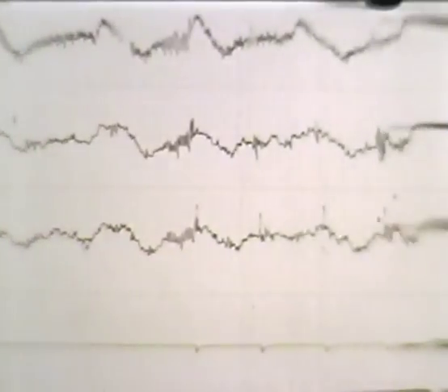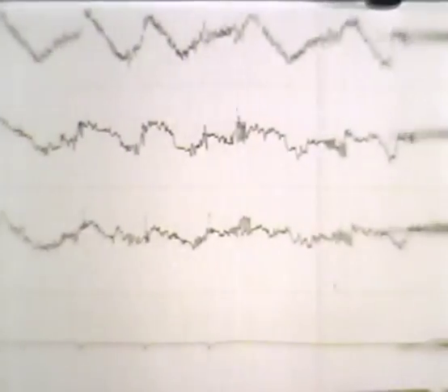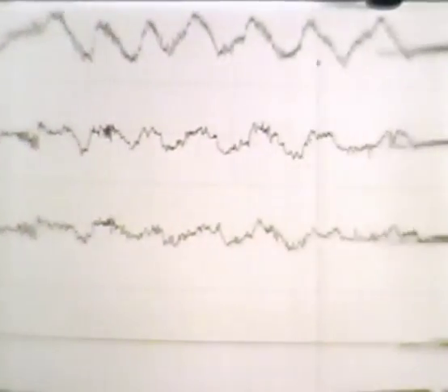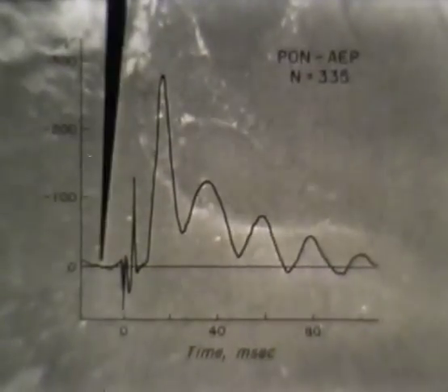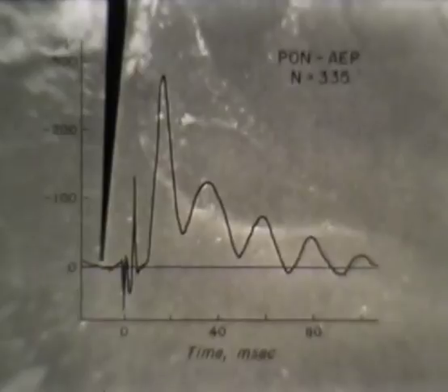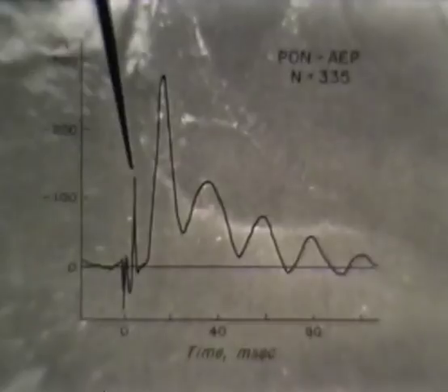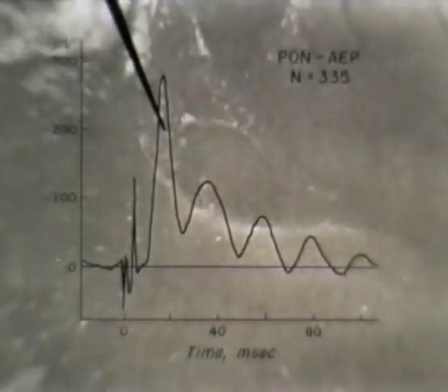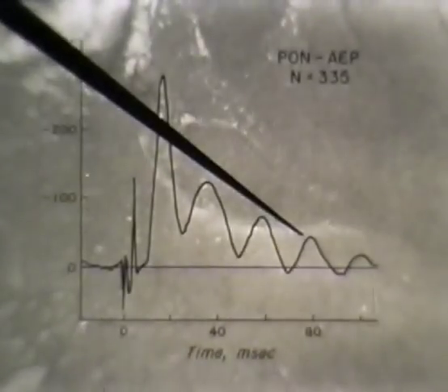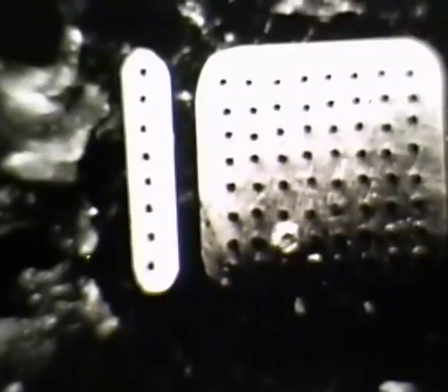Single shock evoked potentials are indicated by the tick marks on the lower traces. Sets of evoked responses are averaged to give an averaged evoked potential. Here is the baseline segment, the shock artifact, the presynaptic action potential from the primary olfactory nerve, the initial surface negative peak of the evoked potential, followed by a sequence of oscillatory peaks of potential superimposed on a surface negative baseline shift.